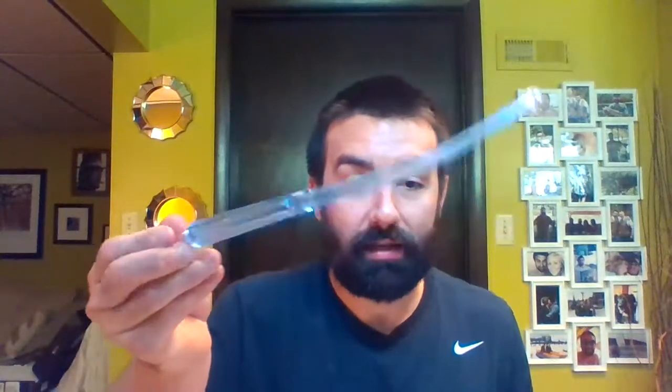Okay, the rigid tonsillar or the Yankauer. These come in a bunch of different variations. Some of them have a little thumb control button, that way it's not continuously suction. Some of them have a sheath that goes over it. This is for your thick, nasty stuff in the back of somebody's mouth: oral secretions, vomit, stuff like that. You aren't limited to only 150 millimeters of mercury with these.